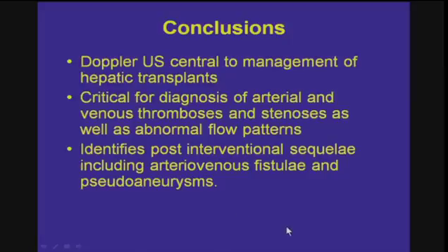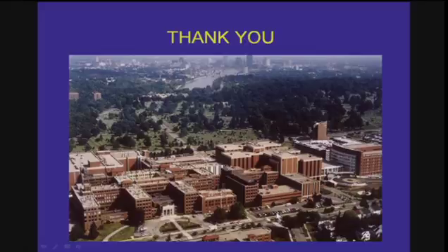So in conclusion, Doppler ultrasound is central to the management of hepatic transplants. It's critical for the diagnosis of arterial and venous thromboses and stenoses, as well as abnormal flow patterns. And it will identify post-interventional sequelae, including AV fistula and pseudoaneurysms. And I encourage you to use it and to be confident with it. And if you don't know what's going on, it's good to sometimes use the CT and go on to angiography. And with that, I want to say thank you, and it's been a pleasure working with you.